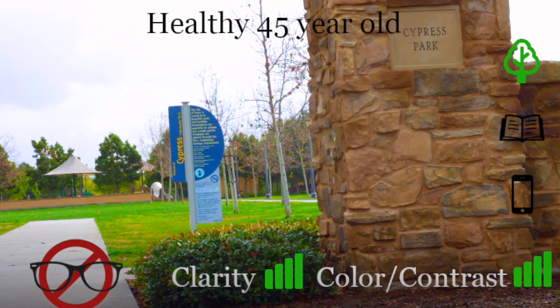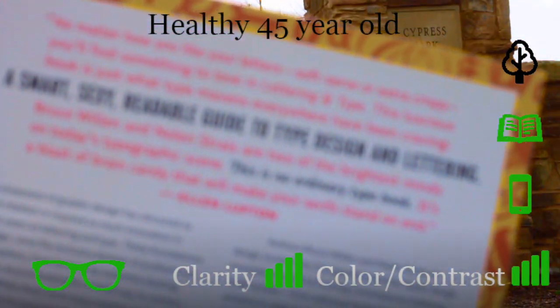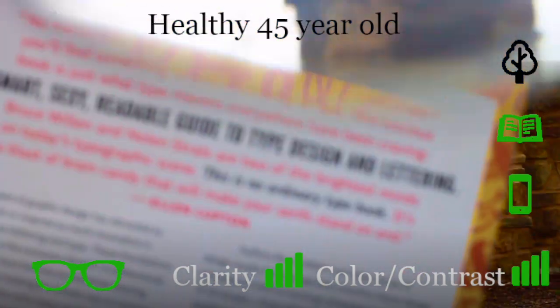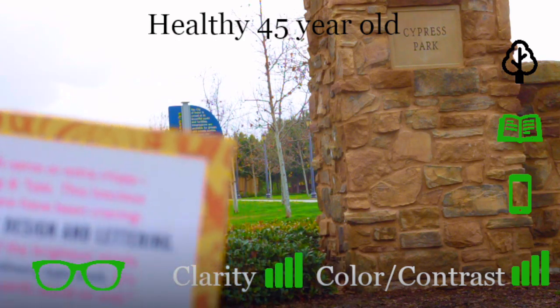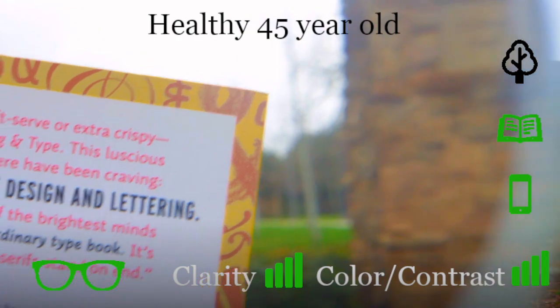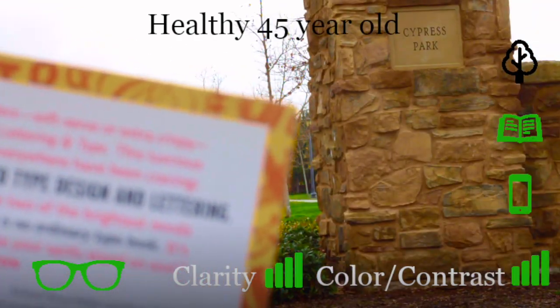This is the vision of a healthy 45-year-old without a cataract, nice and clear out in the distance, but when a book is held up close, things are a little blurry, but can be fixed with glasses like so. A little blurry. Again, the book is held up, a little blurry up close, but with glasses things can be nice and clear, great contrast, great clarity out in the distance.